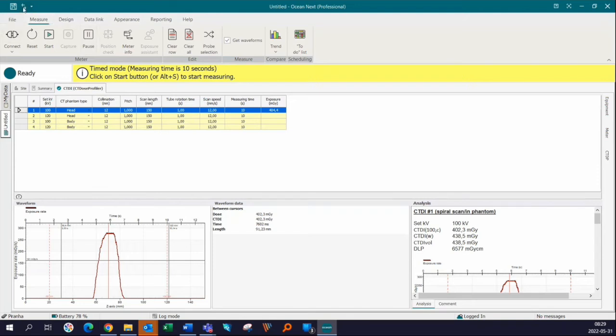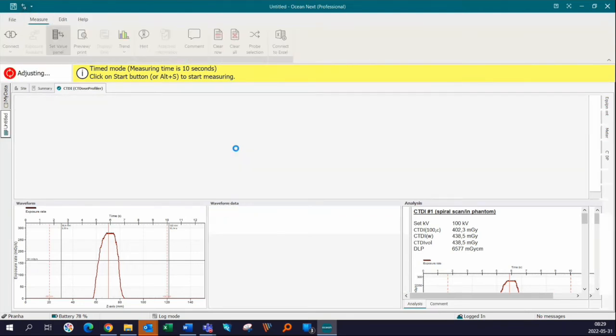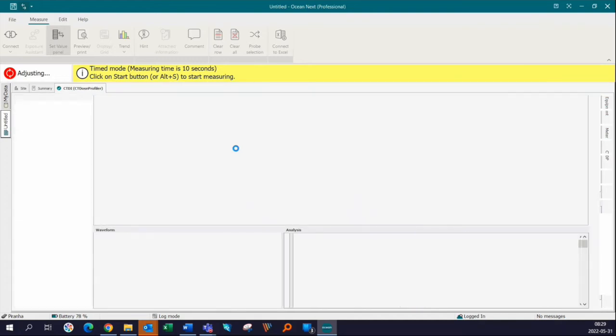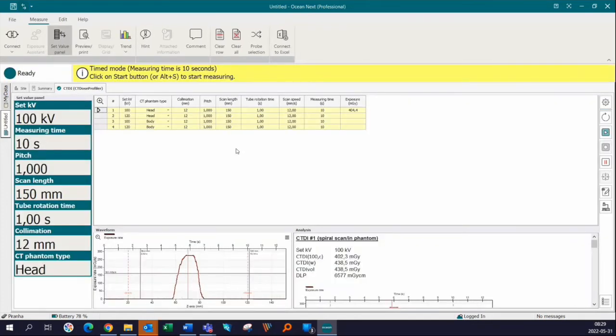But we hope that this new test view will make it easier when you're doing measurements, so that you're not confused by a lot of options you may not ever use when running a test. That's all from me.